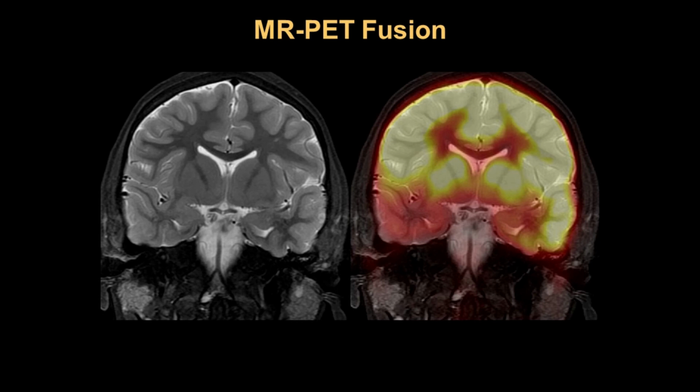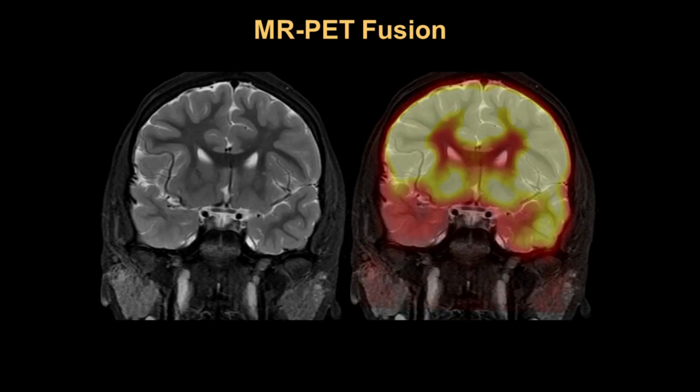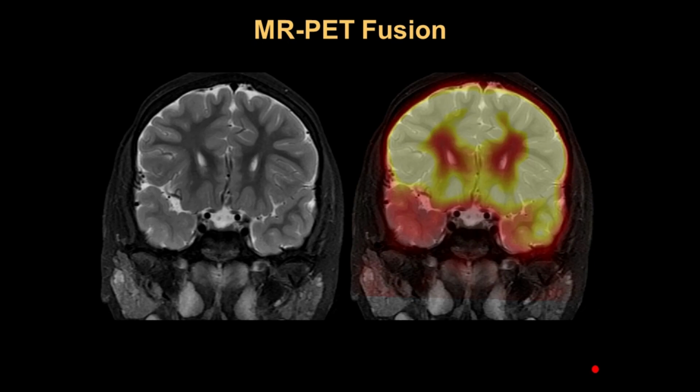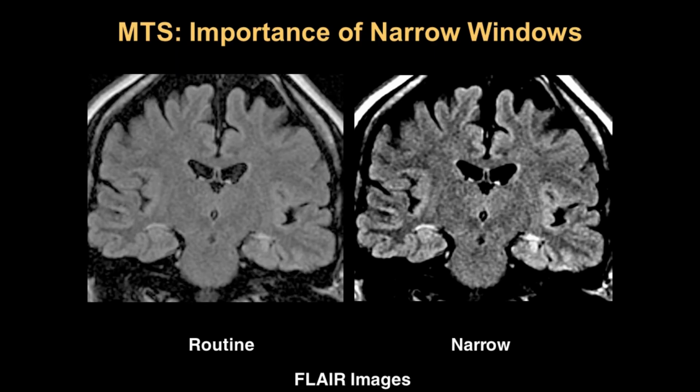And so this is an important feature that we need to recognize short of getting the PET. This is a recognizable abnormality, and now when I show the same images to you, I think you can all appreciate that right temporal lobe at T2 brightness should have been a clue that there's something going on in the right hemisphere. And this is path-proven mesial temporal sclerosis.